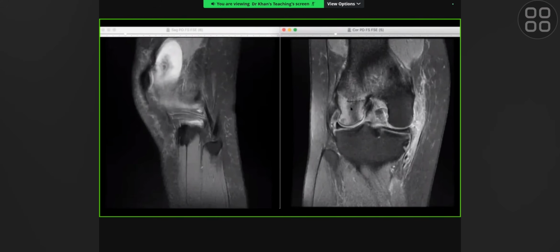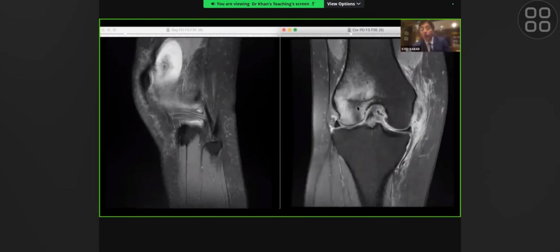Pivot shift. Okay, pivot shift is rotation. This is an impact on the lateral side of the knee. Why? Because all the marrow edema is centered at the lateral. So there's been an impact at this side of the knee. Remember, wherever you get the impact, you get massive bone bruising. On the opposite side, you get less bone bruising. And imagine if the force was coming from the lateral to the medial side, you'd get bone bruising here, but you will disrupt the MCL.